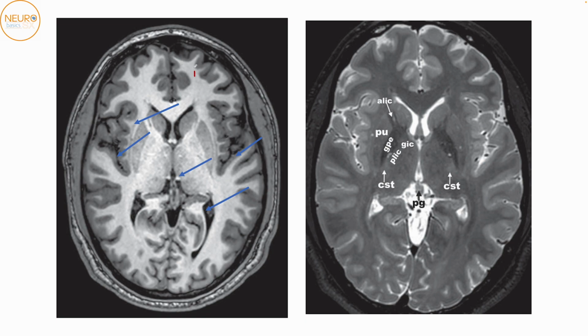You still have the superior frontal gyrus, the middle frontal gyrus, and the inferior frontal gyrus over here. You have the insular cortex, you have the frontal operculum, you have the Heschl's gyrus over here, and then other temporal gyri located behind it, the superior, middle, and the inferior temporal gyrus. This all would be the occipital horn. This is the level of the atrium and the occipital horn over here. This is the quadrigeminal cistern located over here. Okay, so all these things we've discussed and hopefully been able to understand so far.